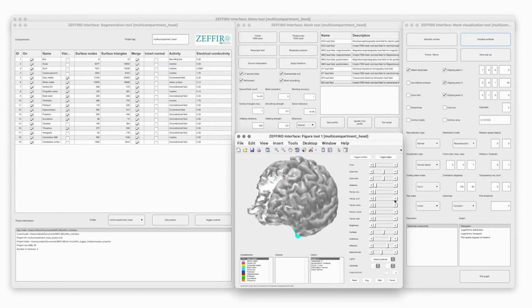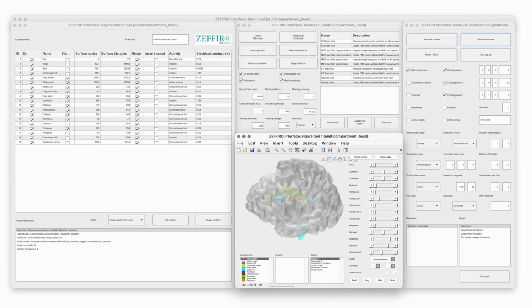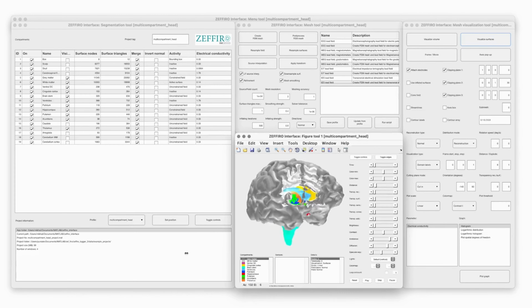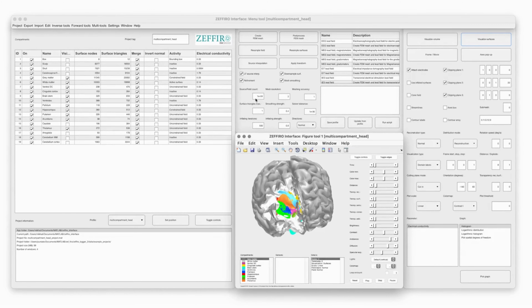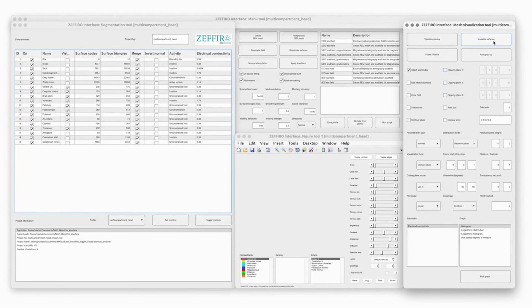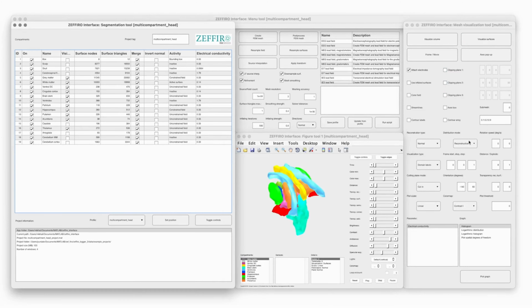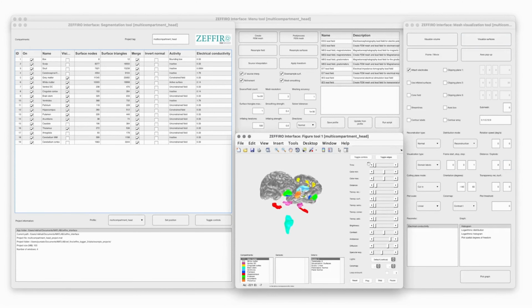The Figure tool is designed for visualizing the 3D head model. It offers various sliders and controls that allow you to adjust the properties of the visualization in real time. Here you can visually inspect the brain reconstruction and have a closer look at interesting regions. Feel free to experiment with different sliders and see how they change the visualization. Remember that you can uncheck the visible toggle for the top layers of the model and click the Visualize Surfaces button again to have a better view on deeper brain regions. Also, you can use the Explode parameter to inspect the quality of the reconstruction of certain areas.